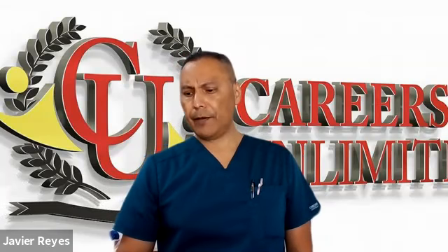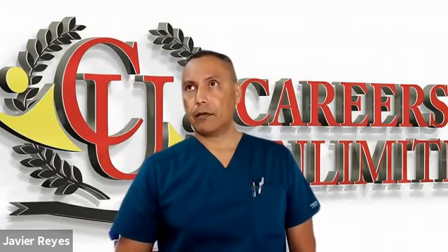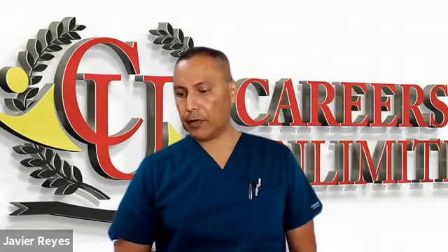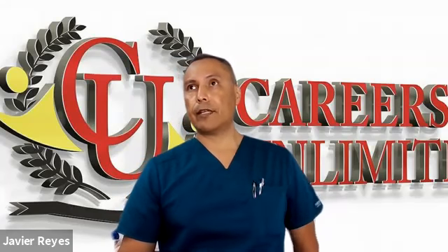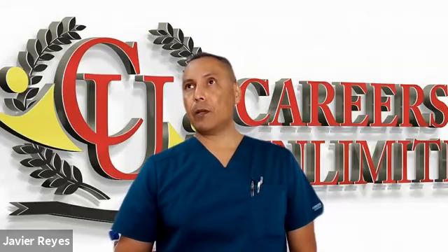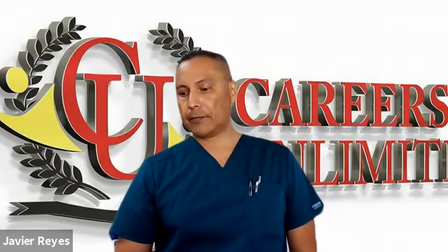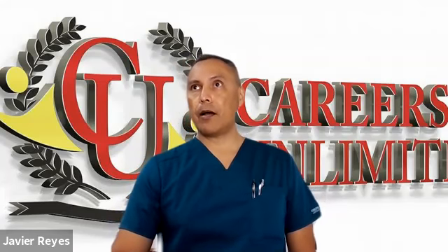Now, if you look at B, it looks like a bird's beak. You want to look at it that way or call it whatever you want. What kind of wave do you see? You have the typical R, and then it comes back down to S, and then it goes way back up. It's a very tall peak.